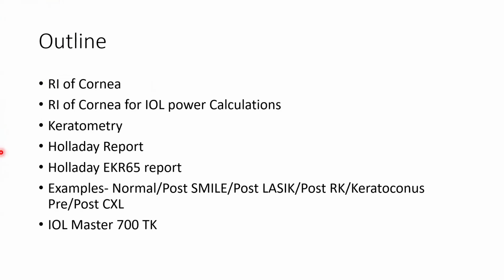In today's class on the Holladay EKR report, we are going to cover the refractive index of the cornea for IOL power calculations, and how it relates to the latest keratometries, the Holladay report, the Holladay EKR 65 report, examples of that, and the IOL Master 700 true K or total K values.